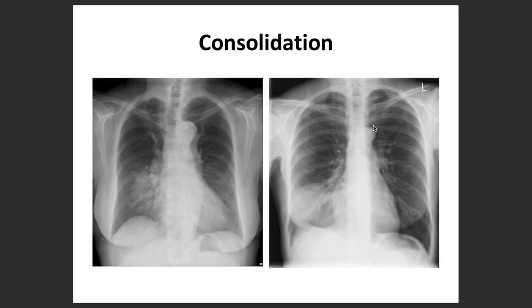What happens is atelectasis or collapse or even incomplete expansion is one of the most common findings which tends to happen. As you may notice, there is opacification over here, as our friend also rightly pointed out. There can be various etiologies for that. If there is mucus plugging, or there is aspirated foreign material, in fact, as well.